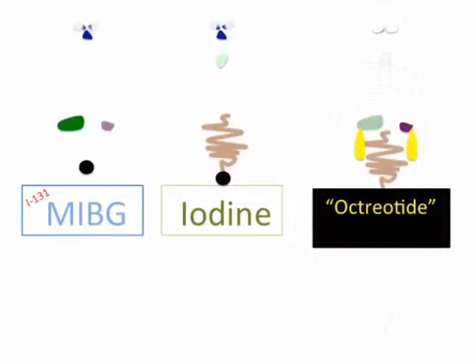Now, let's just run these and compare these real quick, and I'm going to offer a strategy. So remember, the situation here is no bones and no heart. Let's take a close-up look. So we've got a guy who has a liver greater than a spleen, and no liver and no spleen.